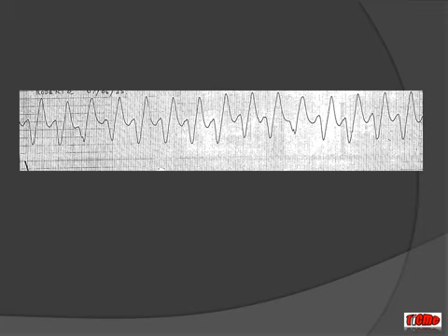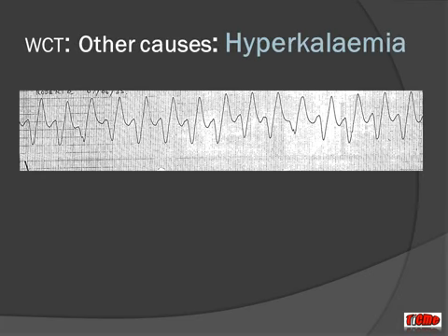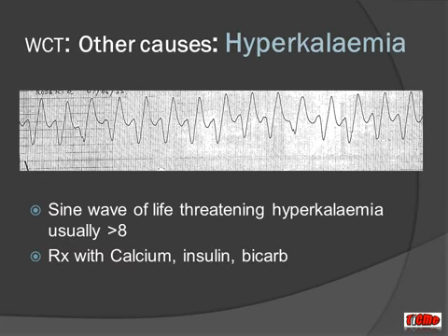The interesting physiology point of hyperkalemia is that it's not usually ventricular tachycardia, although you can have VT provoked. The normal rhythm you get as you progress is actually a sinoventricular rhythm with such impaired conduction due to the hyperkalemia that you get these horrible broad complexes. Therefore, the treatment of life-threatening hyperkalemia is not with DC cardioversion of this rhythm, because it's unlikely to be successful, because this is the sinoventricular rhythm.